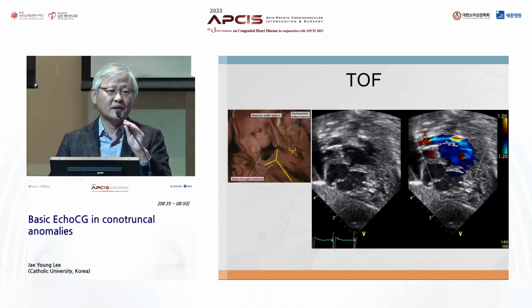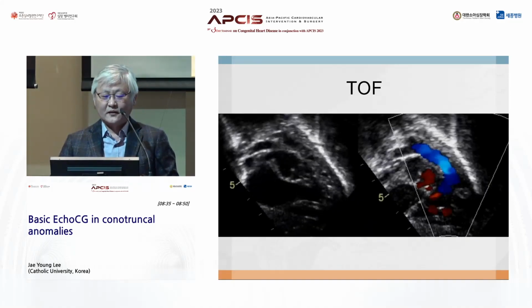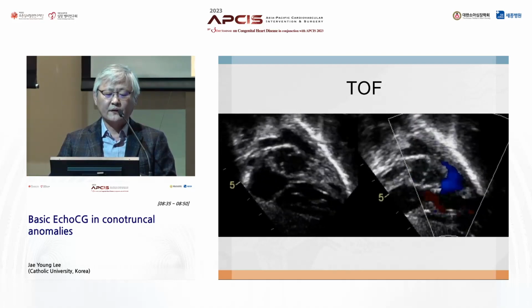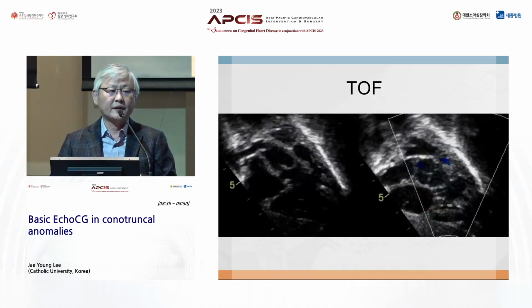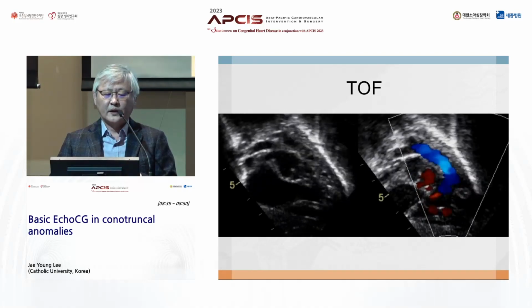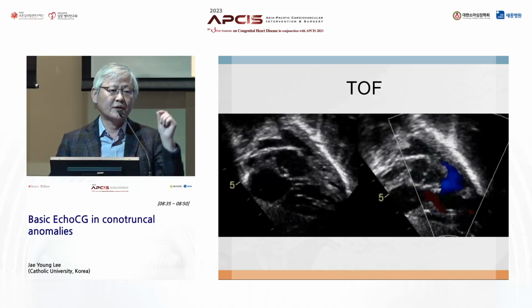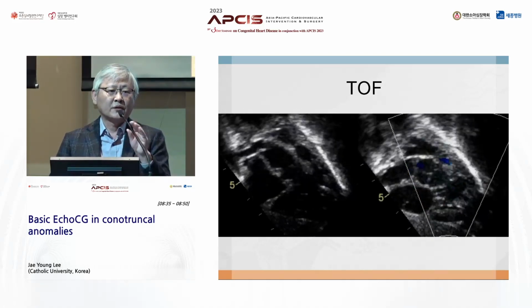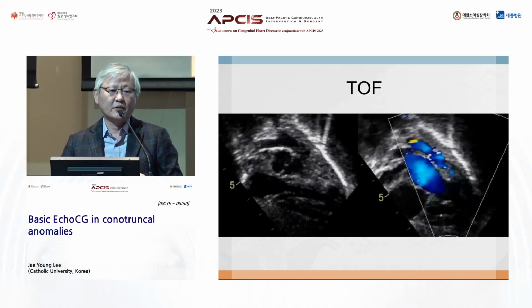From this one image, we can diagnose tetralogy of Fallot, okay? Another patient, the same: large VSD, aortic valve, small pulmonary valve, deviated conal septum, hypertrophied septoparietal trabeculations, and squeezed outflow tract. This patient has a little bit good pulmonary artery system, but long infundibular stenosis.